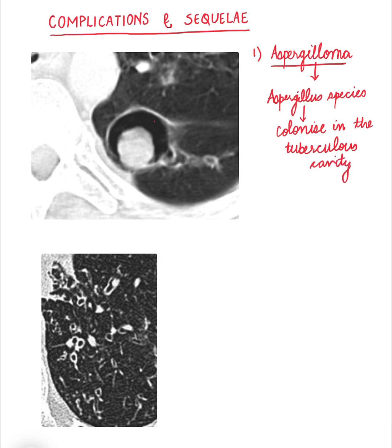As you can see, this is a tuberculous cavity.